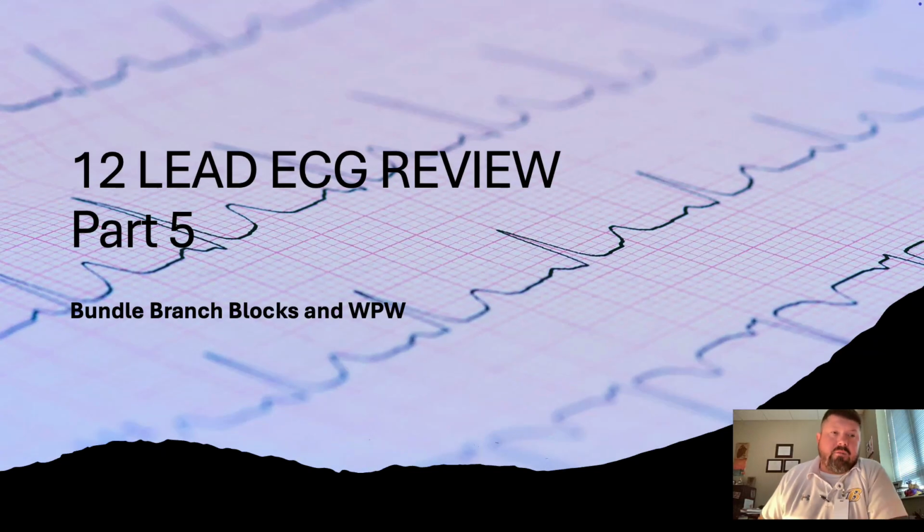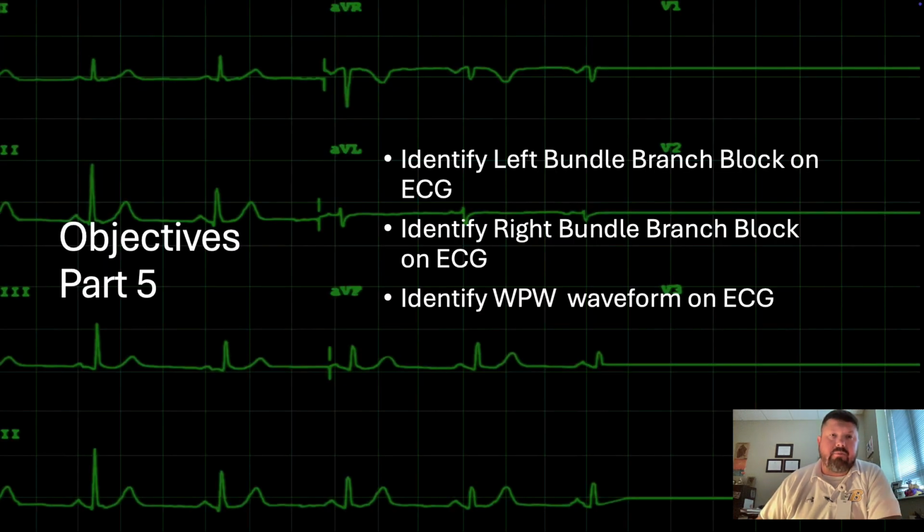All right, part 5 of the 12-lead ECG review. We're going to do a quick review of bundle branch blocks and Wolff-Parkinson-White. Again, this isn't a complete lecture. This is just to help you study and to bring out the high points of both of these topics.